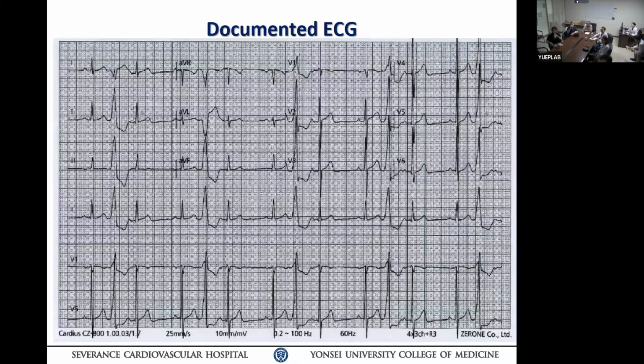Okay. So then your discussion is going to be sinus rhythm with normal AV conduction, baseline rhythm, possibly left atrial enlargement, maybe voltage criteria with perhaps a suggestion of LVH, probably early stage without repolarization abnormality. This is your baseline interpretation. Now then you add your abnormal finding.